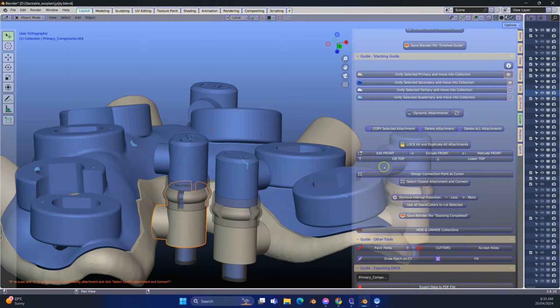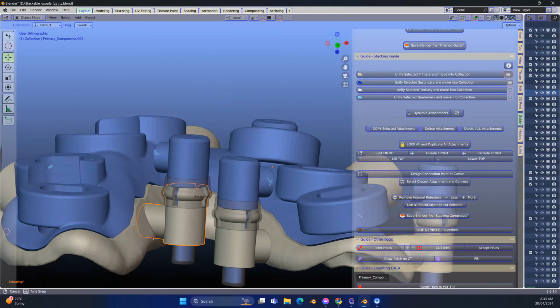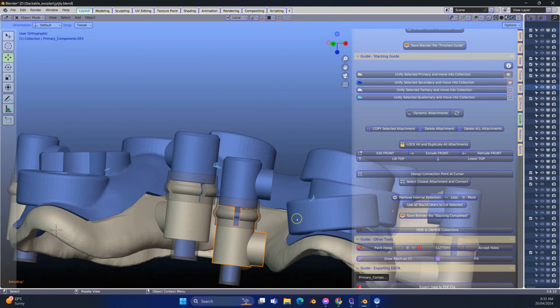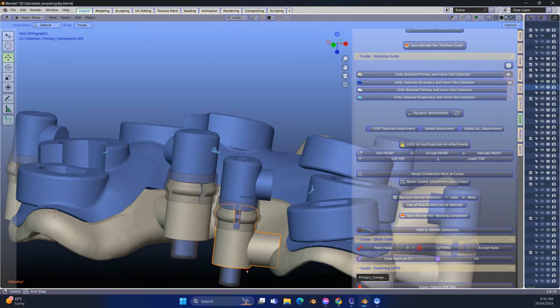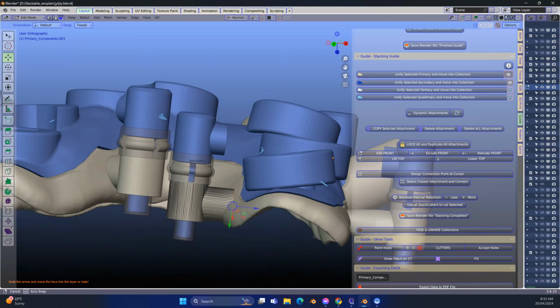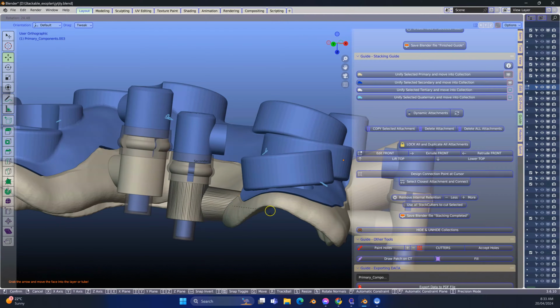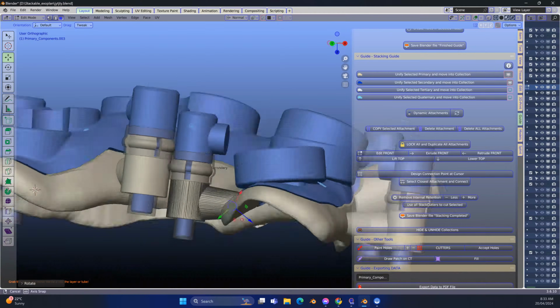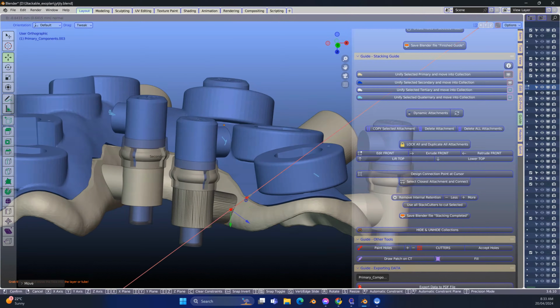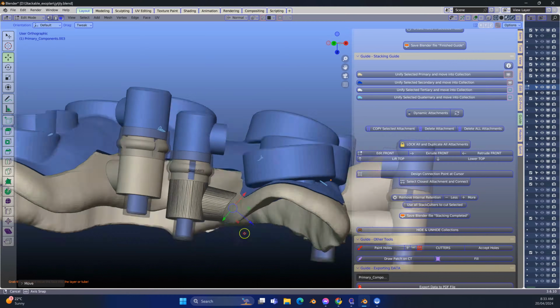Select your attachment, and then you're going to click on Extrude Front, and that will bring it towards the front. So don't extrude it all the way through, otherwise it's going to affect your fitting surface. Here I'm going to do the same thing. I'm actually going to go one step further, edit the front. I'm going to use the R key to rotate the front section. Then we're going to tab to get out of that section.